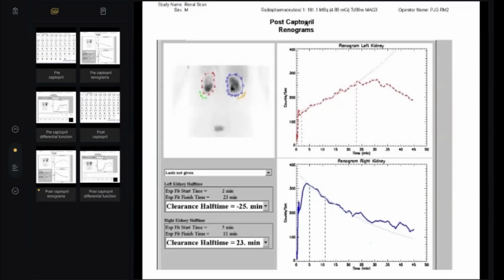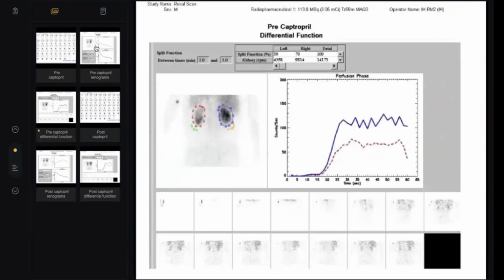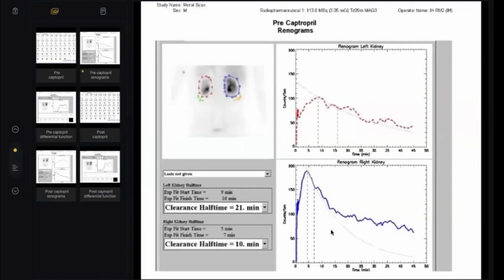I told you before I had one HIDA scan and really the case was atypical and I was so confused. Finally, I told myself it must be biliary atresia. And I wrote everything I know about biliary atresia and finally it was correct, by the way. Here also, when you are presented in any exam by two curves like this, more than 90% this is a renal artery stenosis. Come on, tell us what happened here.